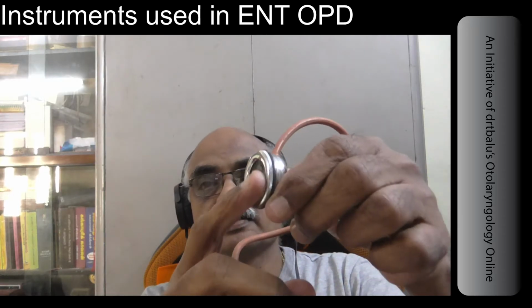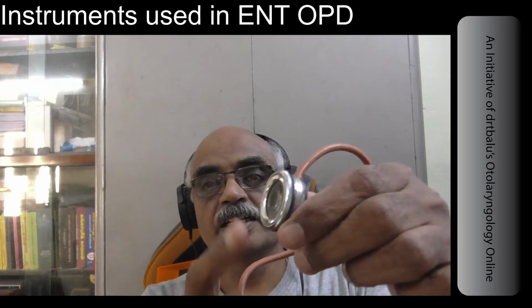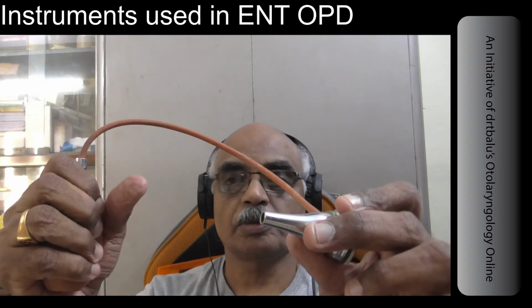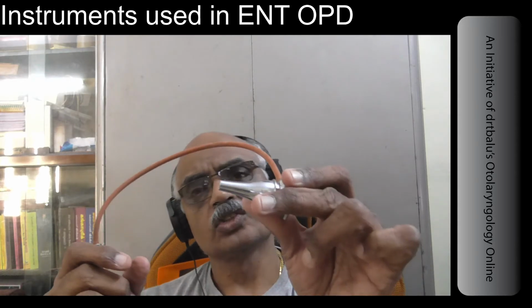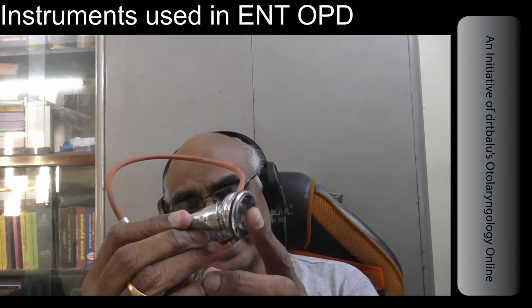The eyepiece contains a convex lens of around 8 to 10 diopters. This lens gives you a 2.5 times magnification of the eardrum. Then it is connected to a bulb. By pressing the bulb, the pressure at the tip of the speculum gets increased. You insert it into the ear canal and visualize the eardrum, getting a magnified view through this eyepiece.